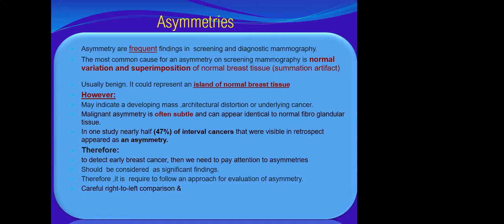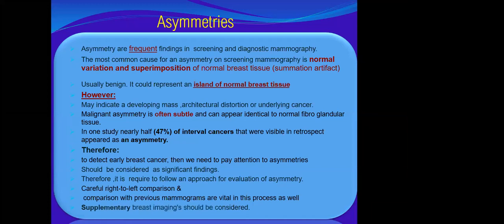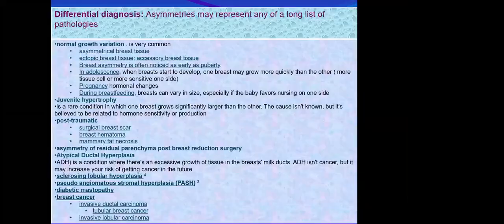Careful right to left comparison, and comparison with the previous mammogram are vital in this process, as well as supplementary breast imaging should be considered.